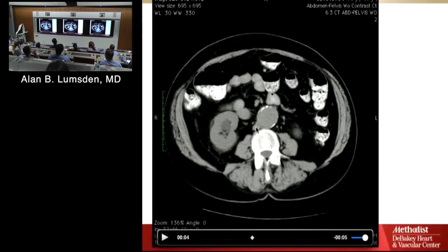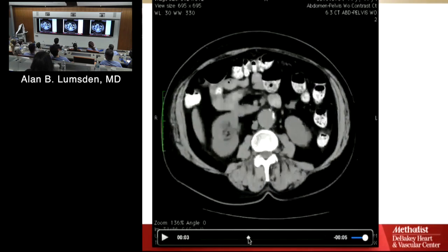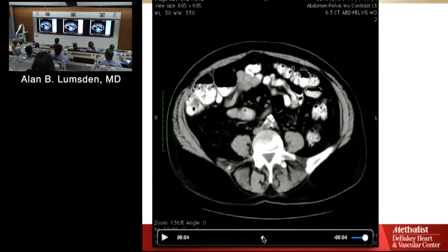Okay, what's that? Maybe you know what that is? Next row. Start at this end. What's that? Watch, I'll give you a clue. Again, I'm going to show you north and south. Right there. Inferior vena cava. Okay, that's the cava. Now, when you do translumbar embolization of a type 2 endoleak, we either come in through there, or you can actually go transcaval, believe it or not. You can come in and go straight through the cava into the aneurysm sac. Okay, bifurcation.